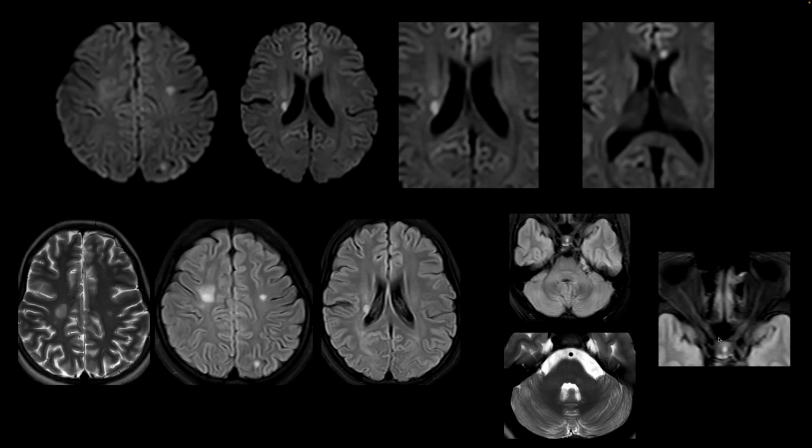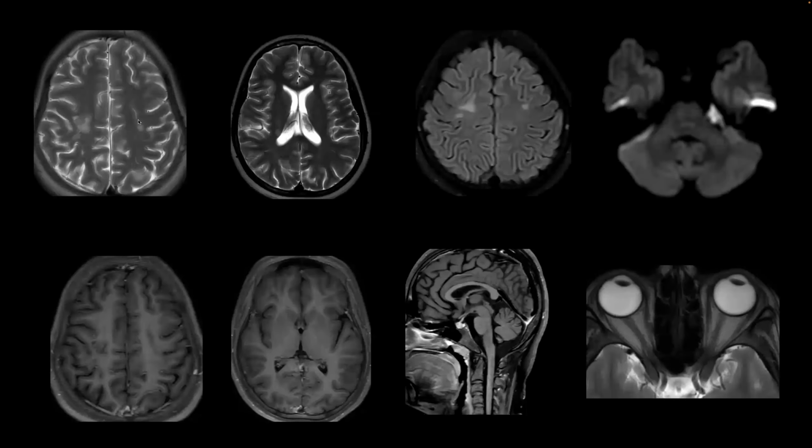This is a non-contrast FLAIR sequence of the optic nerves. At least the intra-orbital segments of the optic nerves appear slightly reduced in caliber. The signal intensity is not that of a neuritis, but the volume is slightly down in comparison to a normal optic nerve. T2 sequences again show similar hyperintense changes on FLAIR. Post-contrast study, there was no enhancement of the abnormal lesions. The visualized cervical cord did not demonstrate any focal lesions, and on non-contrast T2, no edematous changes.